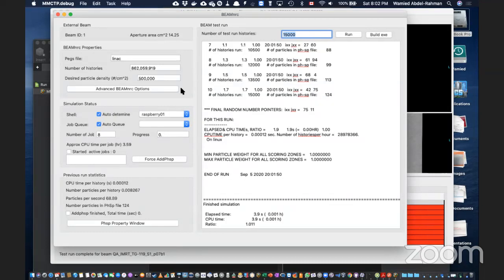But I just want to explain this to you. Then the number of histories required to run is roughly this. And if I'm running this on 8 nodes, parallel processing, this is going to finish in about 3.6 hours. Okay. Now I have 50, so I can change this number to 50. Okay. I can generate this in 34 minutes, or probably 30 minutes.